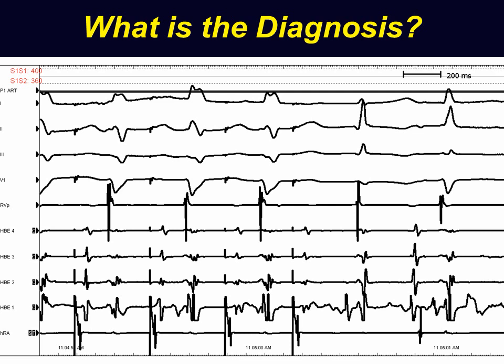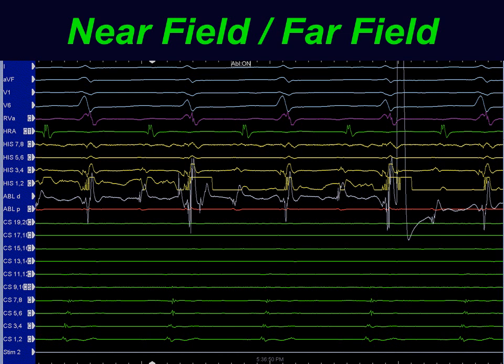And of course, one should consider, here's pacing the A, wider QRS, and then you have the His now visible, and that's because the pathway blocked. So this is characteristic of Mahaim. The stim to pre-excitation may increase before it blocks, and then it comes back up. So Mahaim needs to be kept in mind whenever you have a left bundle tachycardia with superior axis.